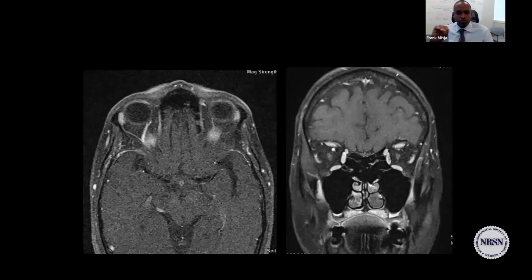It's a little bit more tricky, but I will point out that we have a vessel that's prominent over here at the superior part of the orbit. If it's at the superior part of the orbit, I'm going to call it a vein, the superior ophthalmic vein. This superior ophthalmic vein is 3 times the other one. What are we describing? What are we worried about? Anytime you have dilation of the superior ophthalmic vein, what should we be worried about?